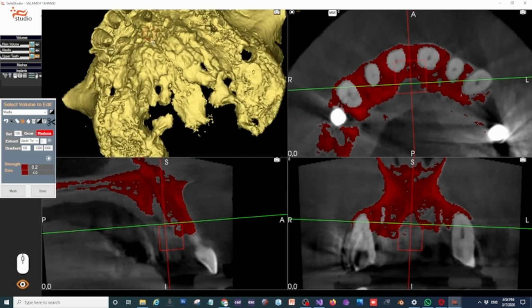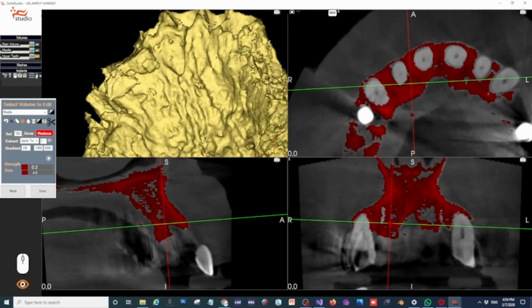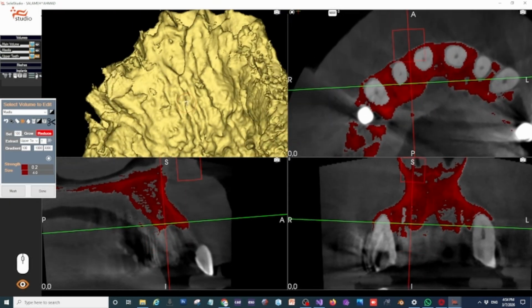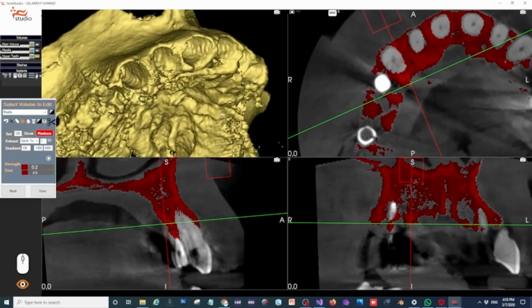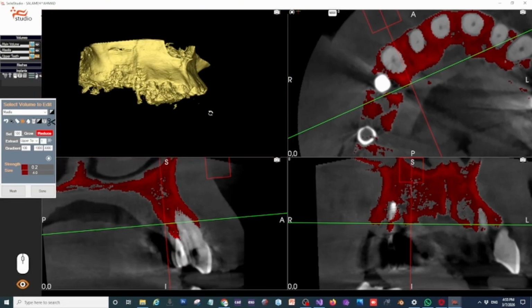As you can see, we have successfully produced a clean, highly accurate segmentation of both the bone and teeth directly from CBCT data. This was achieved entirely on a standard computer without the need for server uploads or external processing.